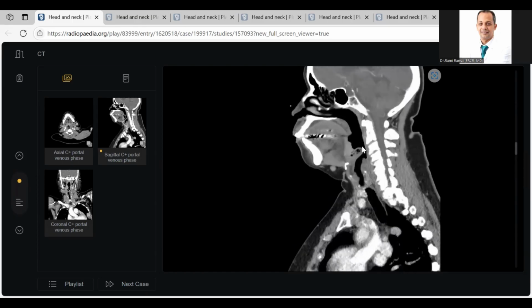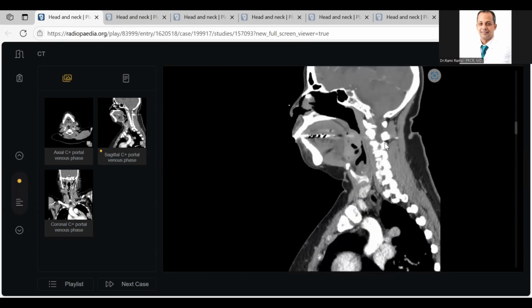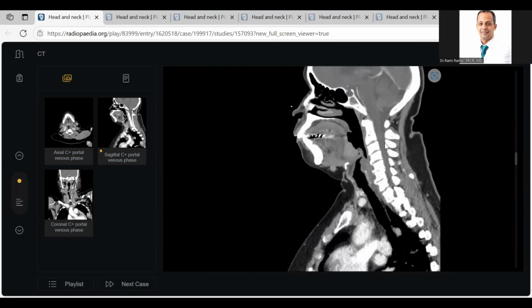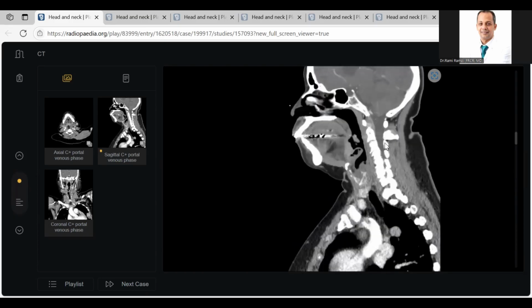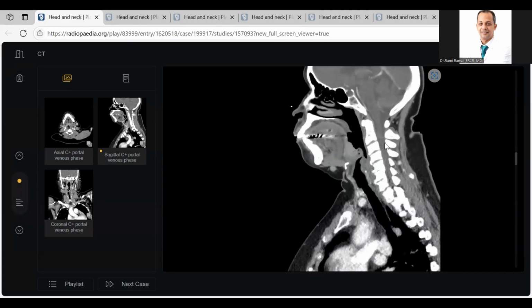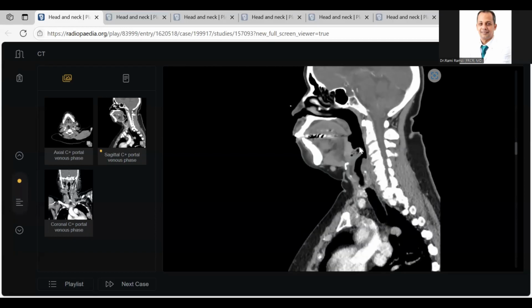What is this? What is just below the base of the tongue? Something closing the larynx during swallowing. I guess it could be an infected laryngocele. Not laryngocele. See, there is something here. You are on the right pathway.